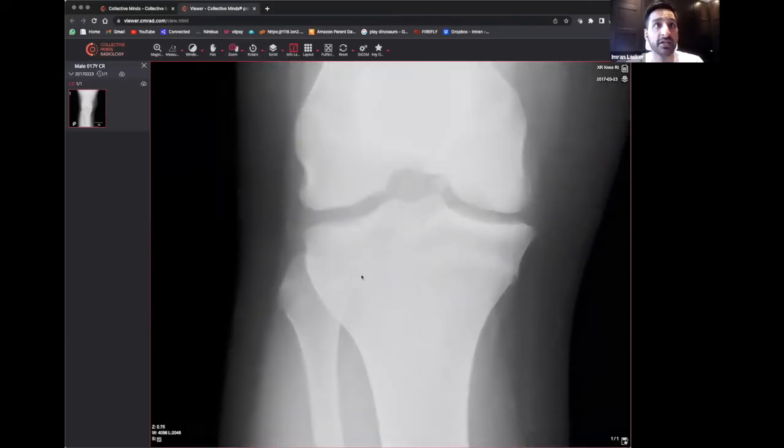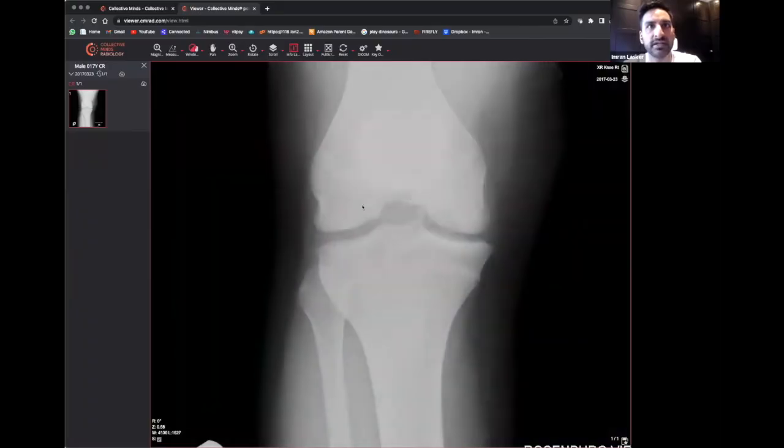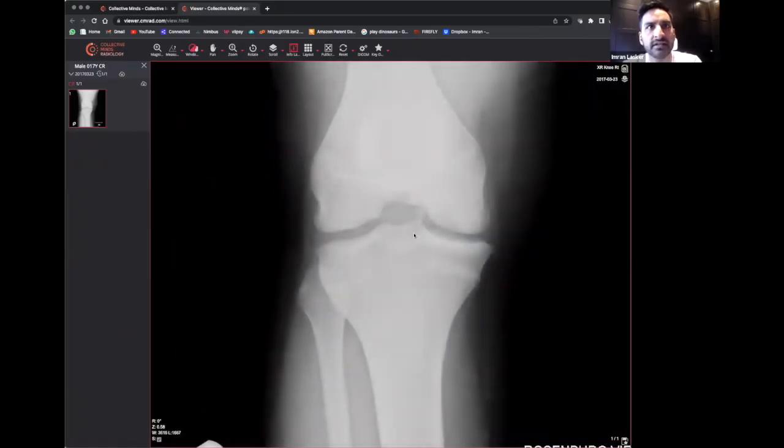So, youngish patient, from what we can see, maybe slightly overexposed, looking very bright white. So what I'll do, I'll see if I can window it a little bit better. And okay, so one of the things you want to be looking for is whether there's any sort of avulsion fracture around this area. You know, it's not going to be coming from the fibular head, but sometimes you get what looks like an avulsion injury, a bit of fleck of bone. And in that situation, you'd be worried about a Segond fracture.